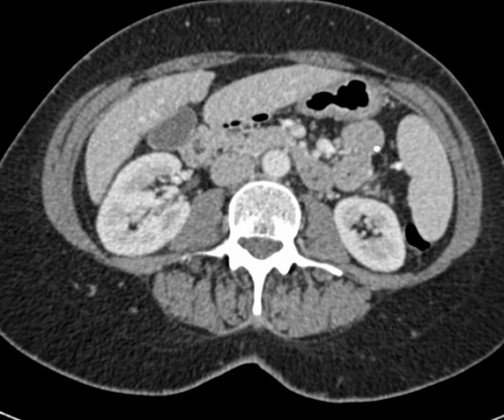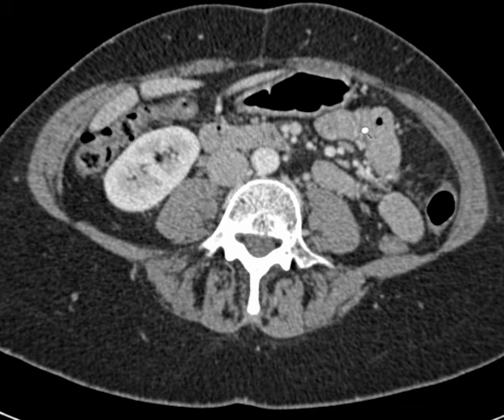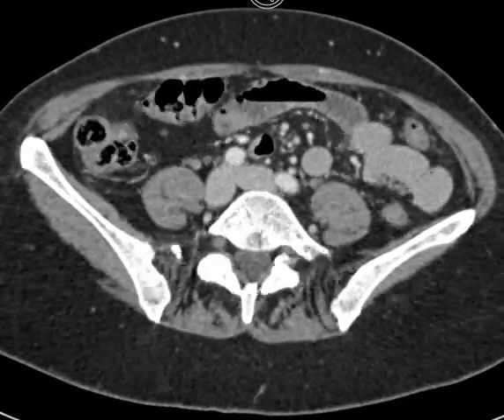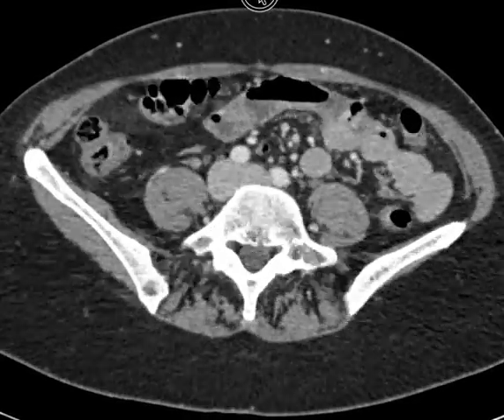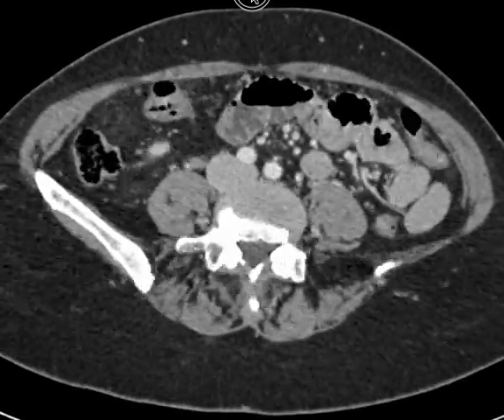And then we have these loops of bowel, that is the proximal small bowel just beyond the duodenum. And these are called the jejunal loops. So here you see multiple loops of jejunum. Most of the jejunum here you'll see is on the left side of the patient. Okay, so here again, loops of jejunum. These will eventually communicate on to other loops of bowel that are more distal, such as these over here, and that head back over to the right of the patient. And that's the ileum. Okay?